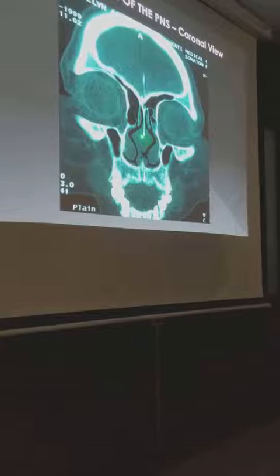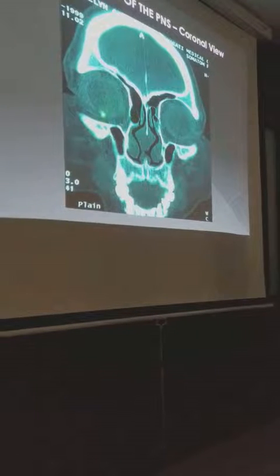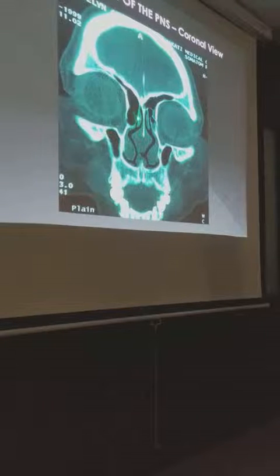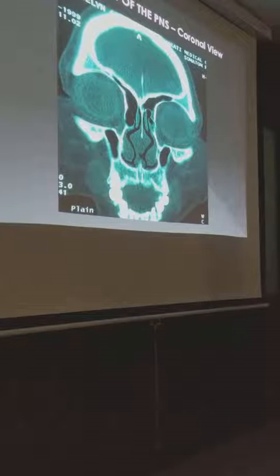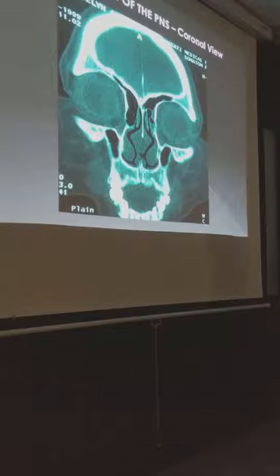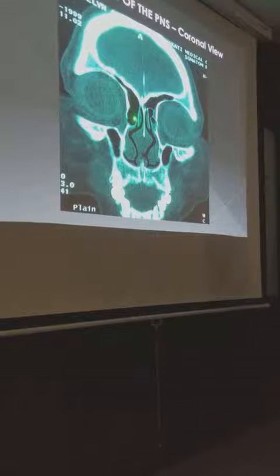Do you agree? Normally, you don't see this. Normally, you don't see that. You just see that, so it's easy to know. But by knowing the relationships, because you still have your lacrimal fossa here, you know that that's an agger nasi cell. Okay? Which is the most anterior ethmoidal cell. Radiologically, that's the first thing you see, because that's the first pneumatized cell that you see on the lateral nasal wall.